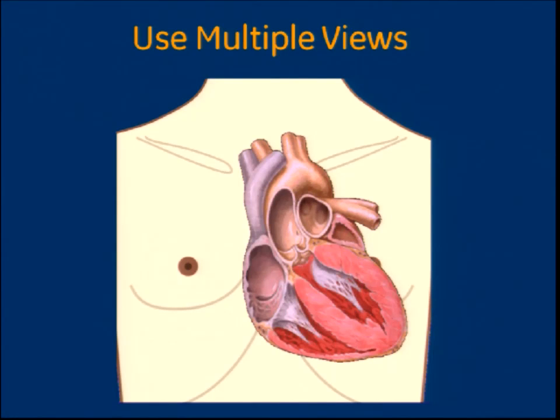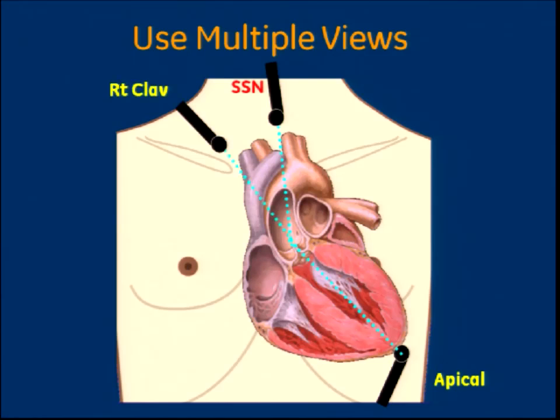these windows that routinely should be examined in any patients with aortic stenosis and also prosthetic aortic valves include interrogation from the apex, suprasternal window, right supraclavicular window, right sternal edge, and very rarely you can get signals from the subcostal window depending on the angle of direction.